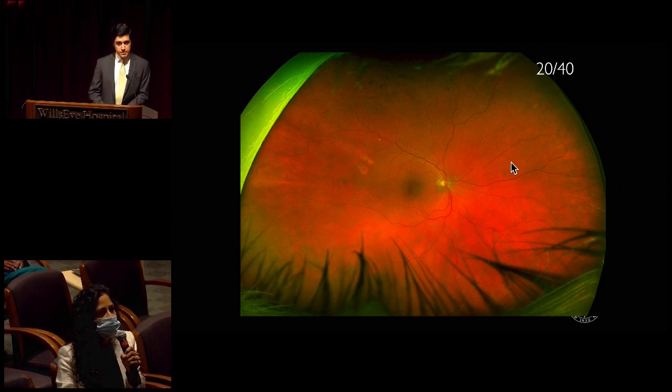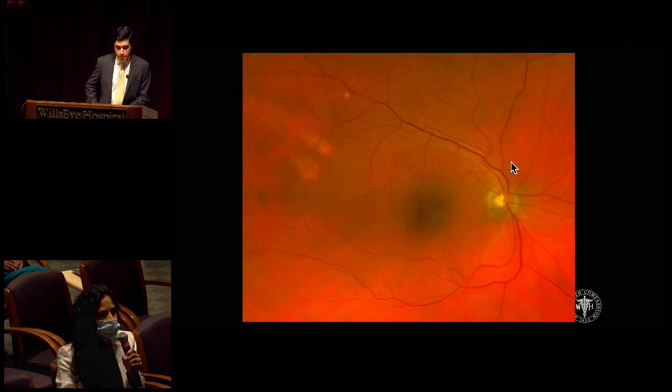Attention is drawn to these hypopigmented round lesions in the supratemporal macula. And then maybe in the macula here, hard to say for sure because they're pretty zoomed out. I'll zoom it in a bit. Oh yeah, this is much better. So here we have this radially oriented, hard to say if it's retinal or choroidal folds. Definitely concerning for some, I don't know if these are exudates or fluid. OCT would be helpful.